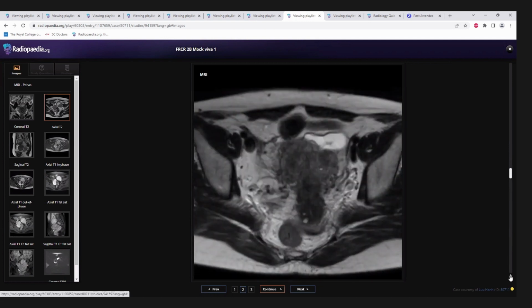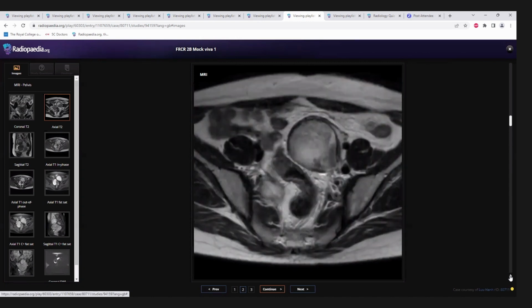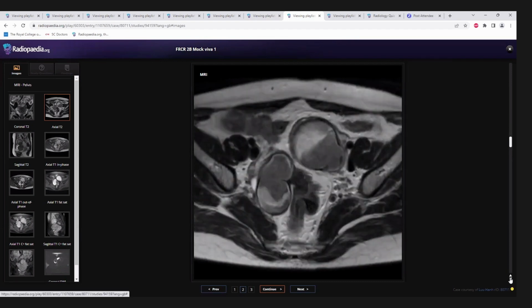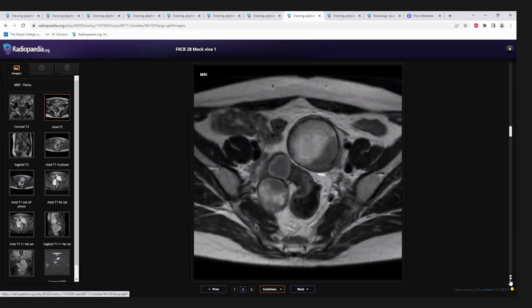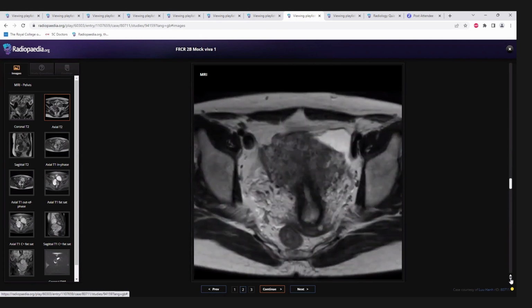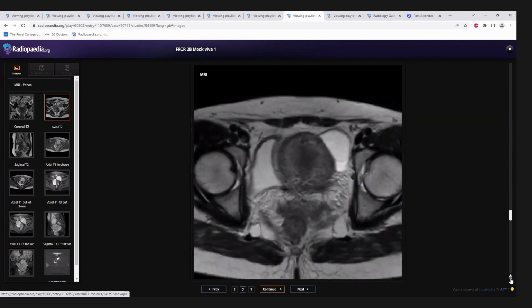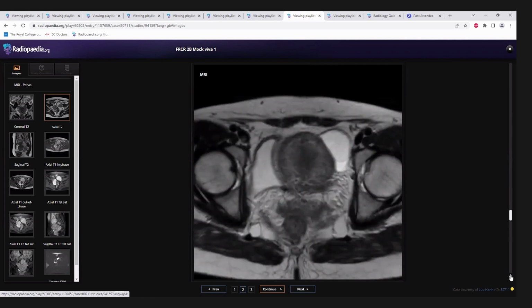So the uterus is looking normal. And the right fallopian tube appears to be distended. I can see the incomplete septations, also suggesting hematosalpinx on the right side. I'm looking at the parametrial fat planes to see any intermediate signal deposits, but ideally a T1-weighted axial sequence would be more useful for that.